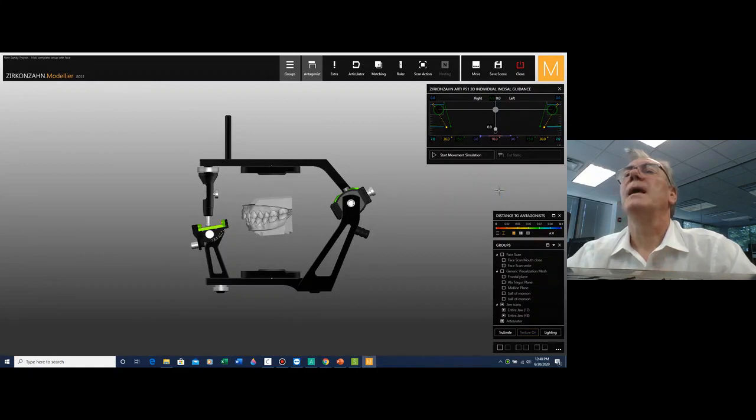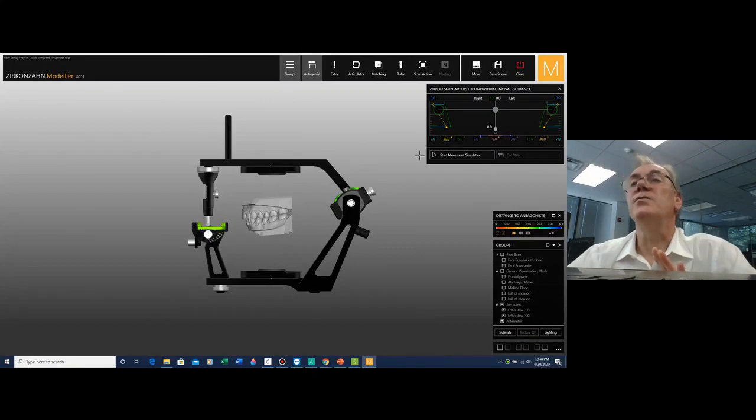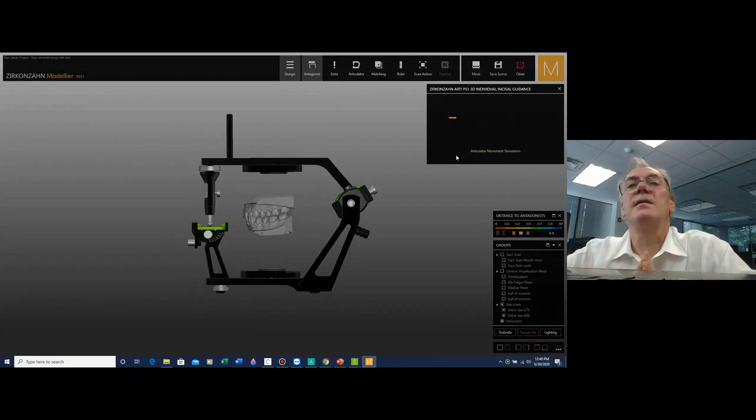Got it. And at this point, I can also bring the incisor plate down to 0. I'm not really interested in the incisor plate to perform any type of movement, so it goes down to 0. And now I want the computer to read the surface of my teeth, and off it goes.